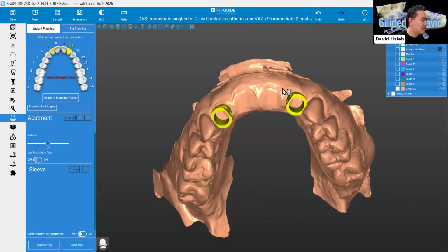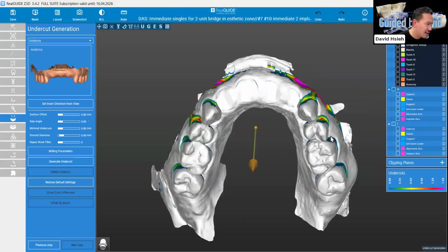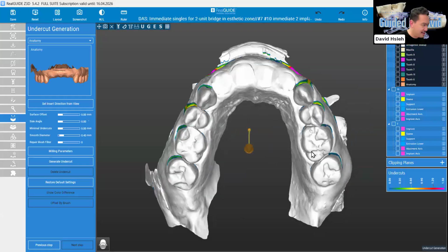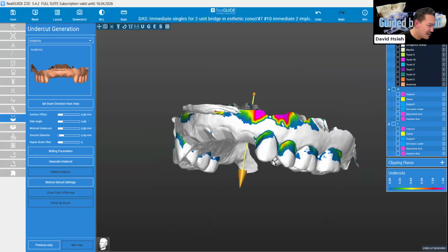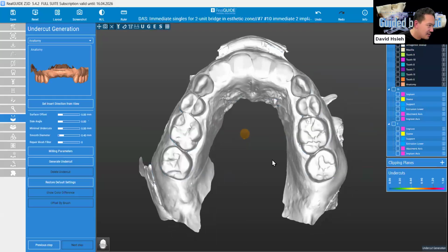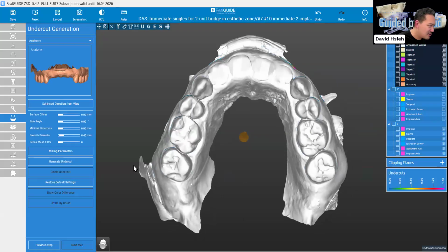So for guide design, because it's a seating jig, it's a removable appliance, right? So the very important thing is to define the path of insertion, right? This is what we learn from dental school or the lab. So you can aim for your survey line, to maximize all the contour as possible, and then set.